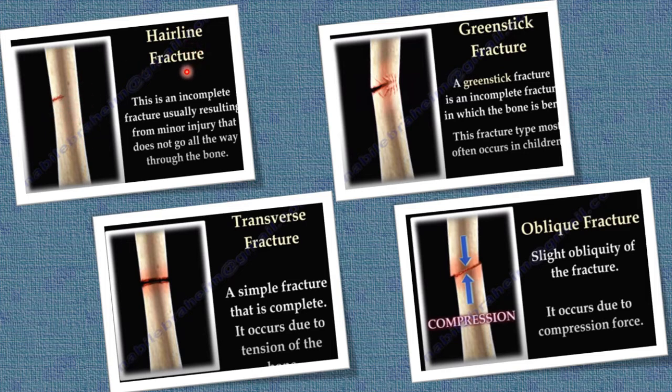and more commonly it is called as a hairline fracture, or we also say कि बाल आ गया, हड्डी में बाल आ गया है, तो that is the hairline fracture, right? बाल आ गया जिसको बोलते हैं.